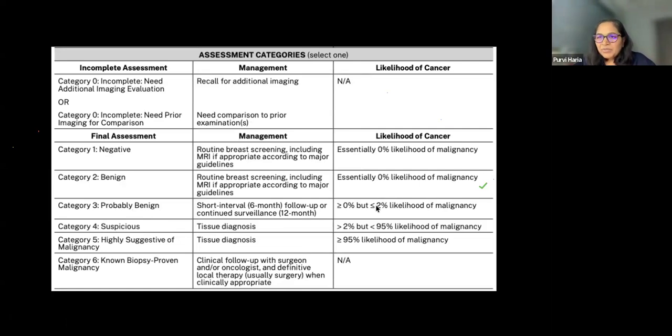We do at times, when discussing with surgeons, say it is probably a 4A. When I have given BI-RADS 4 for small lobulations or some heterogeneous internal enhancement, not homogeneous enhancement, my level of suspicion for those lesions is low, so I might say it is probably a 4A type of lesion.